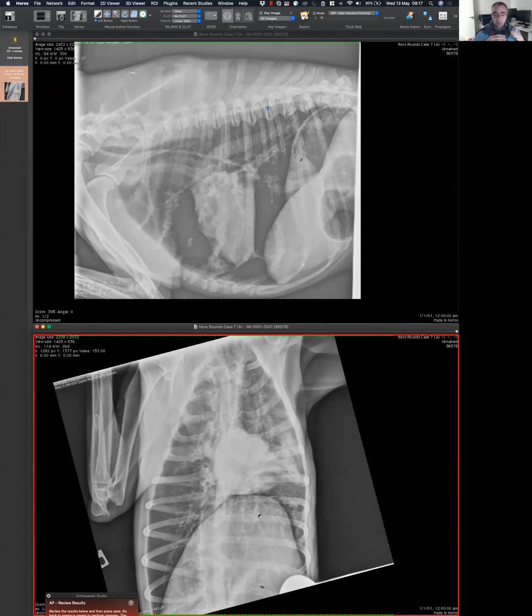In the case of having fluid within that lung, now we are going to erase those lung vessels. Make sense? In this case, it's not in contact. They are in different levels. Vessels here are surrounded by gas. They are soft tissue. They are superimposed over a soft tissue structure like the liver. So we can still see them. Superimposed, but we can still see them. Same comment, and we can start clearing up your comments.